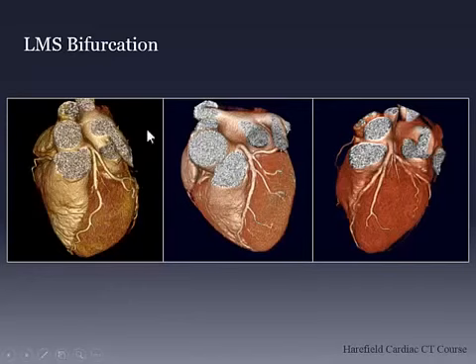But you should always use the volume rendered images from the point of view of giving yourself the 3D anatomy. Where the volume rendered is very helpful, it's not for identifying stenoses, but to give yourself the 3D orientation. It's extremely helpful in coronary anomalies, because you'll often understand the courses much better when you look at the volume rendered. The difficulty is if the coronary vessels run in myocardium, then the volume rendering won't work very well. But this is great because all your surgical colleagues love these sorts of images.